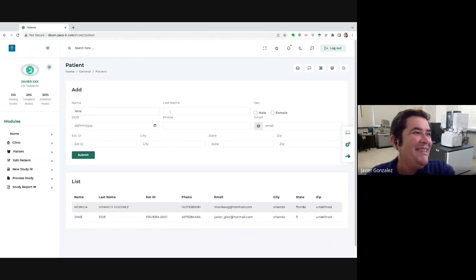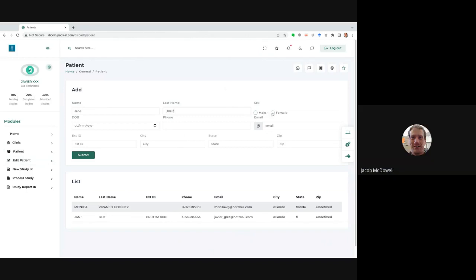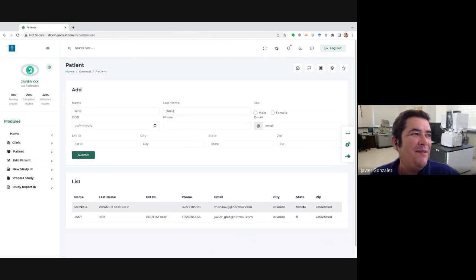Jane. That's funny. Well, let's put Jane Doe number 2. Or Jane Bond, whatever. Or Jane Bond, yeah. So, date of birth, whatever. Phone number, all the information.